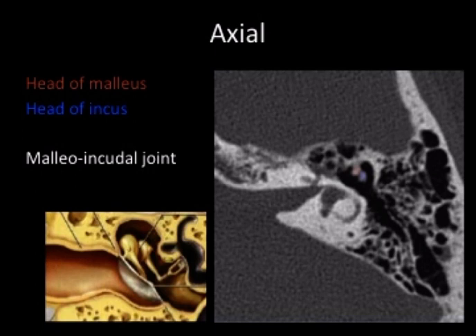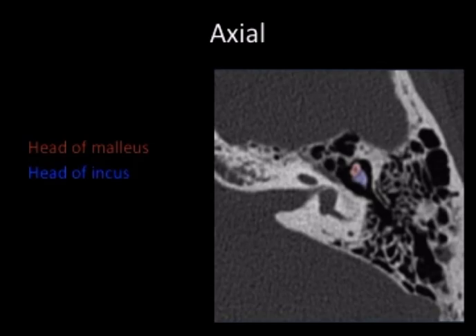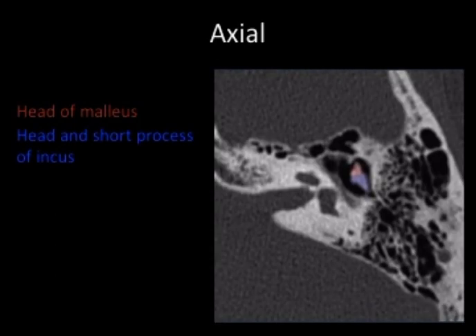The ENT surgeons in our place often use the malleoincudal joint. As you scroll down, you again have the head of both of those, and you're starting to get this ice cream cone. If you come slightly further down, you get a decent cone. This little triangle here, the cone, is the short process, and you won't really see it on any other sequences. It just disappears after that.